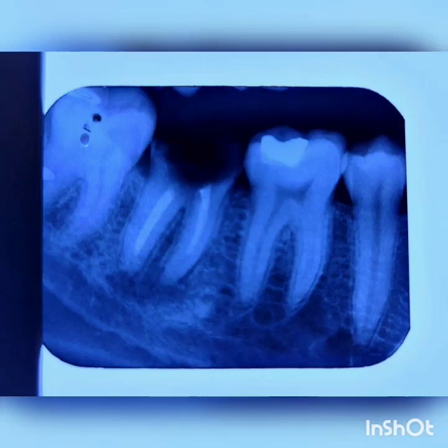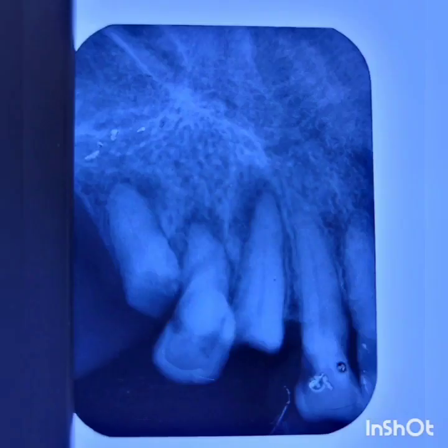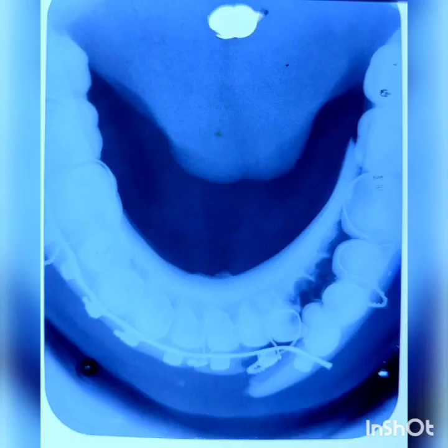For occlusal view x-ray, answer like it is occlusal view x-ray of mandible or it is occlusal view x-ray of maxilla. In case of orthopentomogram, anatomy is always maxilla, mandible along with lower half of maxillary sinus and nasal cavity. Other extraoral x-rays of skull like paranasal sinus view, lateral view or posterior anterior view, the anatomy is always skull.